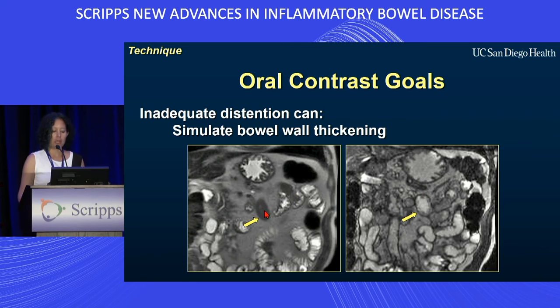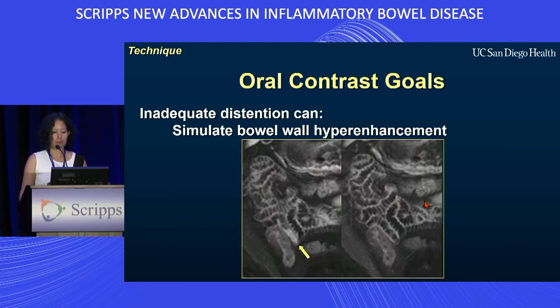of peristalsis. And so MRI enterography does afford us the ability to look at the same loop of bowel over and over again over the course of the examination during all these different sequences. So as a radiologist, we always want to see, does this loop of bowel look abnormal on every single sequence? Because if it's not a fixed abnormality, it's not a true abnormality. But in order to avoid more pitfalls, more distractions, more time spent trying to evaluate loops of bowel that aren't truly thickened, we want to achieve that uniform distension.